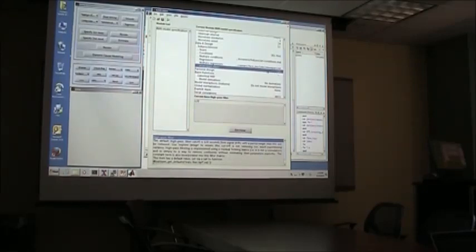In most cases, the defaults here are fine, but it is good to be a little bit aware of that, especially in a block design where the stimuli of a certain sort are presented really far apart.